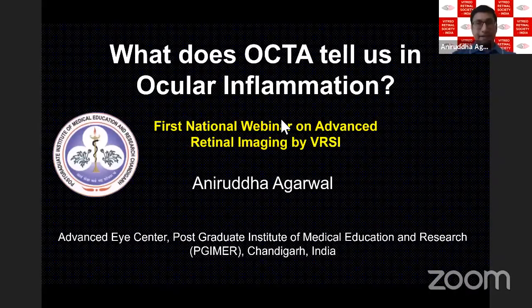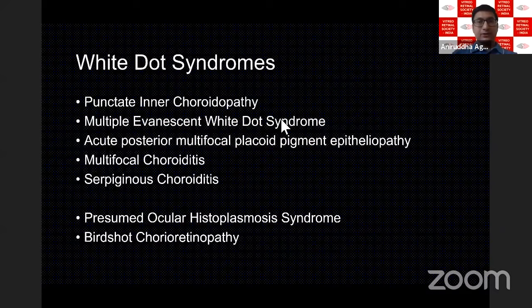We have seen a number of very nice images of the medical diseases of the retina, and how different the uveitis is from these conditions, and what information OCT angio gives us in these conditions. Now, because of the lack of time, I'll focus on very specific entities that we commonly encounter in our clinics and often find challenging.